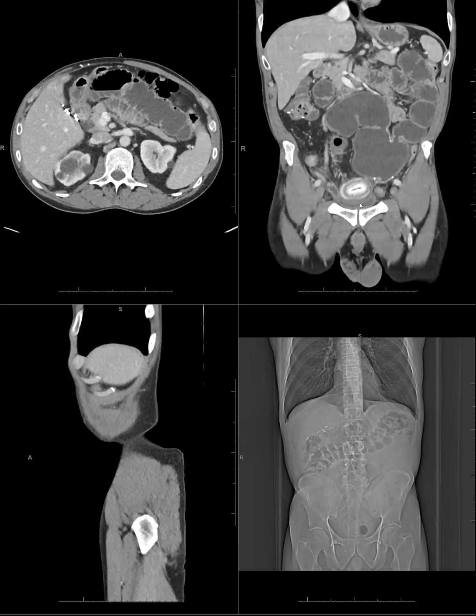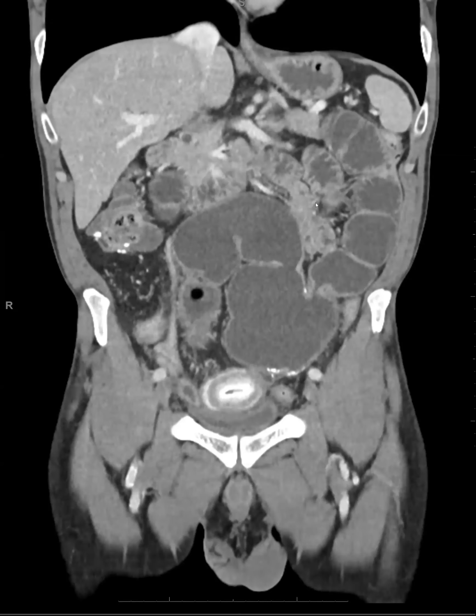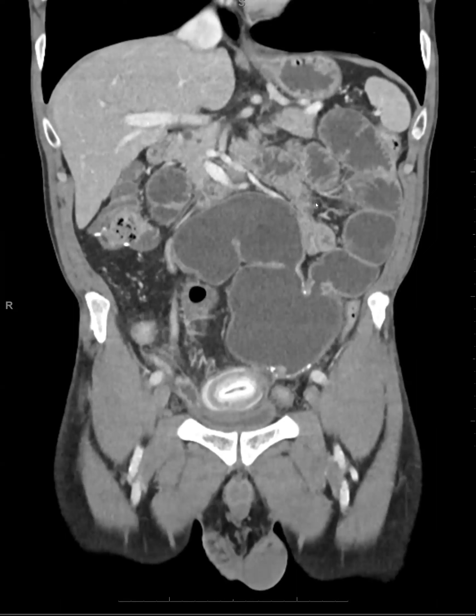This was a fecalith versus a gallstone that somehow stayed in there a while, even after the gallbladder was removed, causing an obstruction, and that's true. And the patient did have a surgery with this removed, and for some reason I don't think they sent it to path, so I don't really know which of those two entities this is. The lamellated appearance makes me think gallstone, but there are case reports.